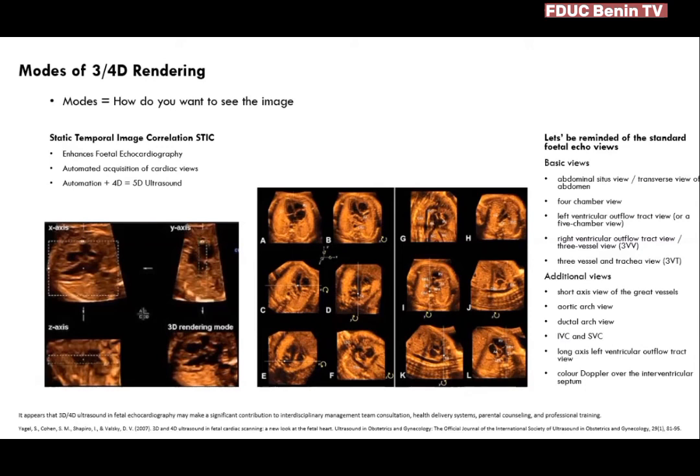So when the patient lies on the table, with time all views are displayed, and then the images are sent up for evaluation. So that's really good. And then to add that once automation comes together with 4D, most authors are beginning to refer to fifth dimension ultrasound, and that simply means that in addition to the 4D, we add certain levels of automation.